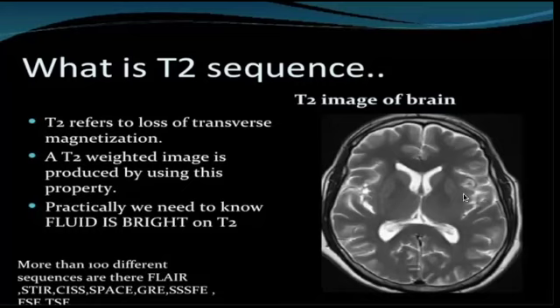However, if you are working in radiology in the future, just forget about this, because mostly whenever they want to confuse radiology students, they find situations where the ventricles would be white and ask students whether this is a T2 or T1 image. But for your level, whenever you look at the CSF and you see that it's white, just think that this is a T2 sequence. After you graduate, forget about this. Just don't rely on it for the rest of your clinical practice, okay?